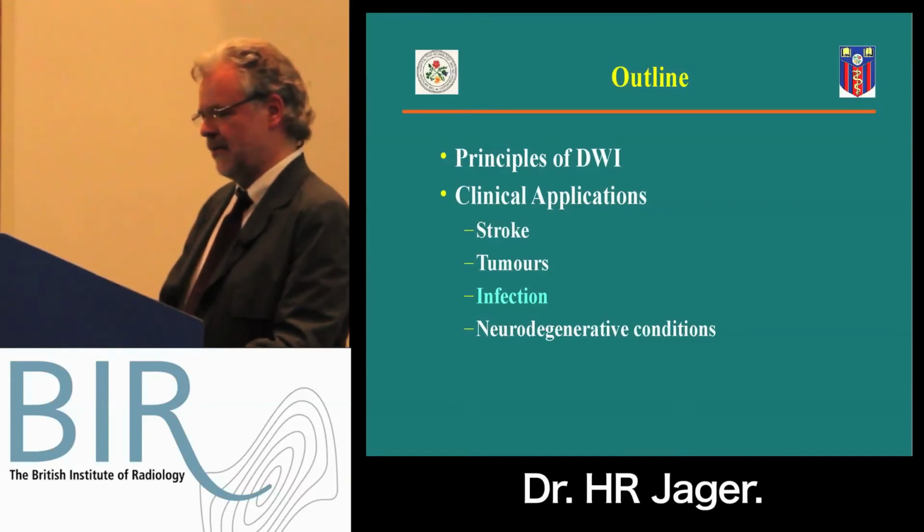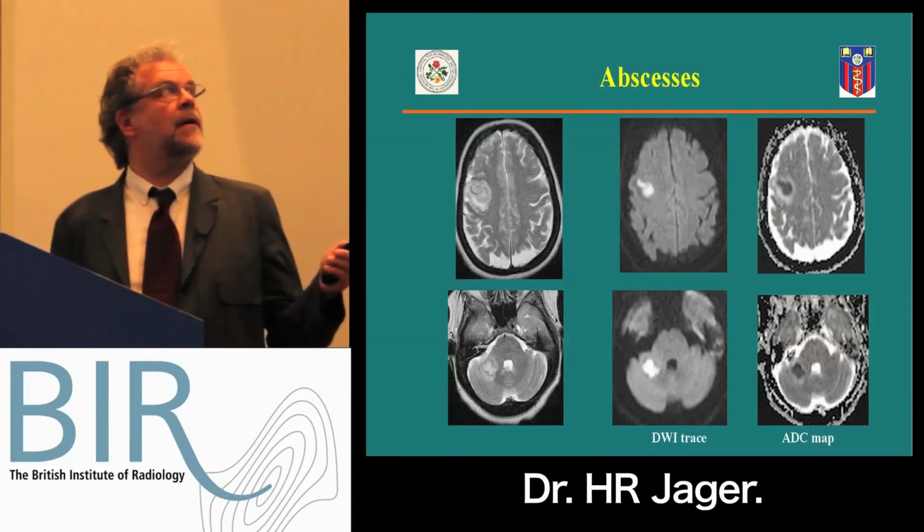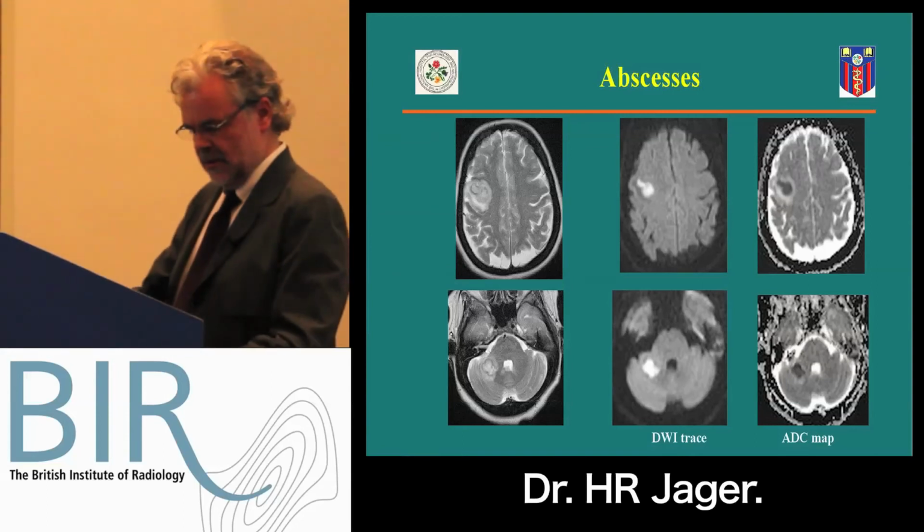Next big topic is infection. We had already talked a little bit about abscesses. I'm going to speed up. Again, typical abscess, dark cavity, surrounding ring, inner lesion.